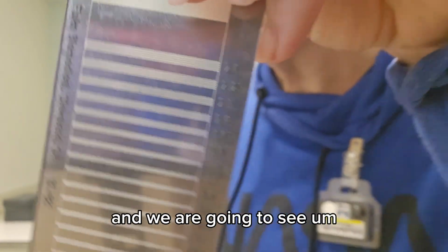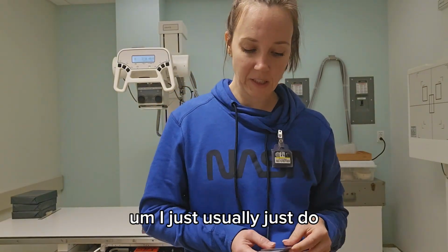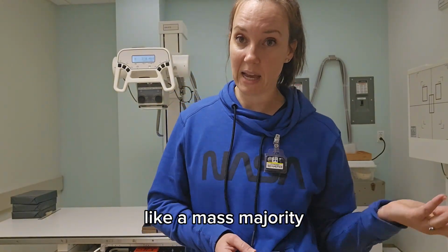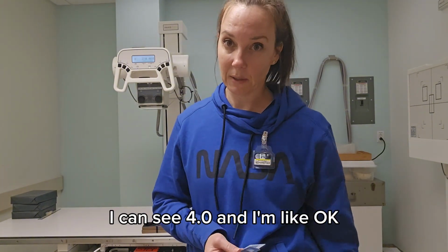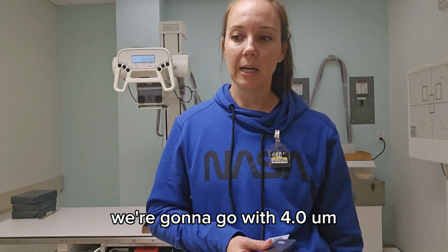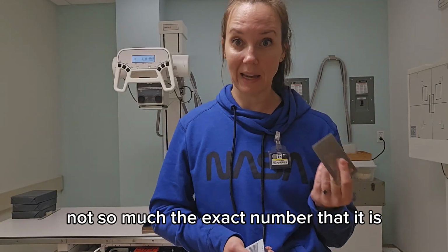So what we're going to do is take some x-rays and see. It is kind of subjective, right? I usually just go with a mass majority. Whoever says, oh, I can see 4.0, and I'm like, okay, we're going to go with 4.0. The whole point is just to see how it changes, not so much the exact number that it is.